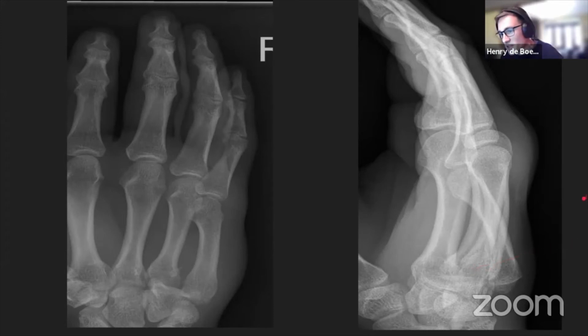Okay, so Mustafa, I've seen your question. We'll go back once we've done this one. There was no bony growth on the previous. It was an old fracture. The answer was old fracture, no acute injury. There wasn't a bone lesion. I hope that answers your question. If not, let me know. I can show you again.